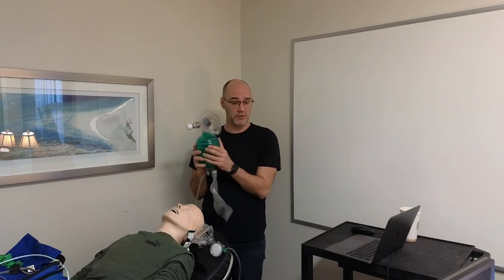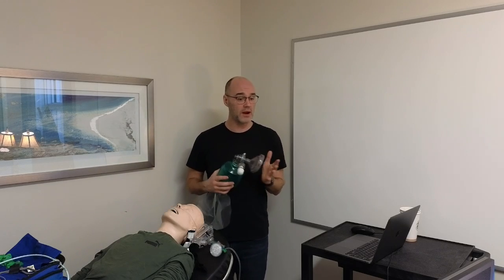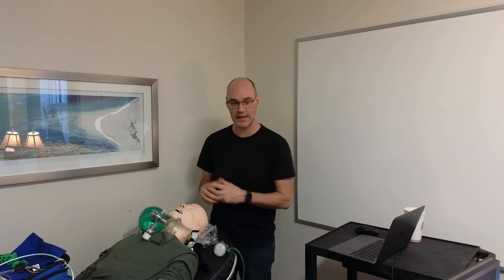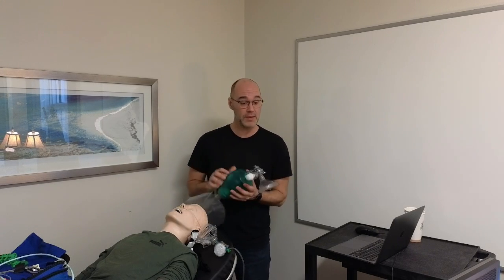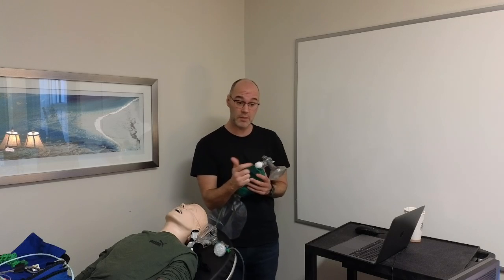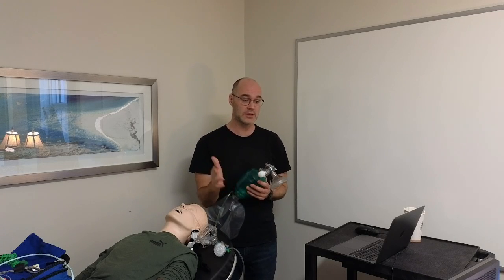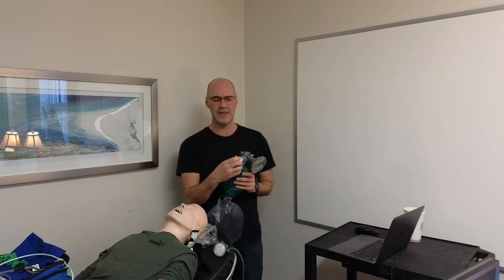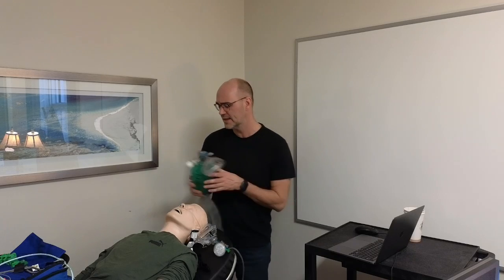Now, when we turn to think of when we're applying the bag valve mask and providing BiPAP, we just need to be aware if we're bagging for that patient. Now, issues around level of consciousness and airway still exist, but we're able to easily access them, and we're supposed to continually monitor and suction as necessary and maintain airway patency. But that PEEP valve, we should be thoughtful around as we apply pressure in a patient that's not spontaneously breathing, that we can watch if our patient's hypotensive. So that should be very judiciously applied in that context and kept low typically.